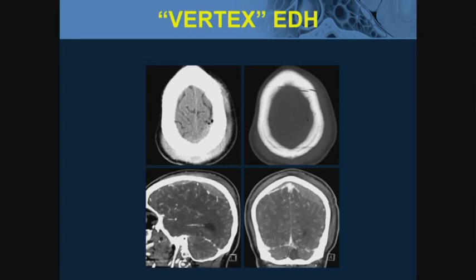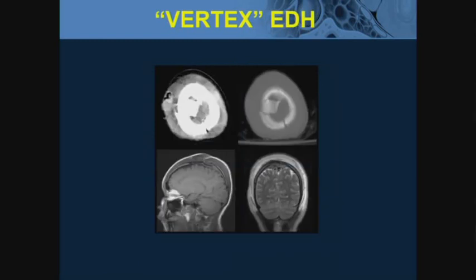Watch me carefully over the next 24, 48, or 72 hours, because they can slowly accumulate blood and slowly cause increasing mass effect on the underlying brain. These guys are dangerous. They don't require immediate evacuation usually, but they do require close interval follow-up and observation.